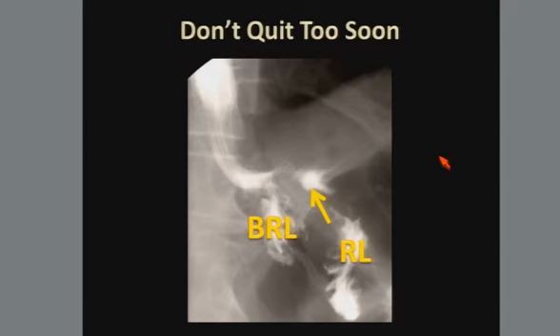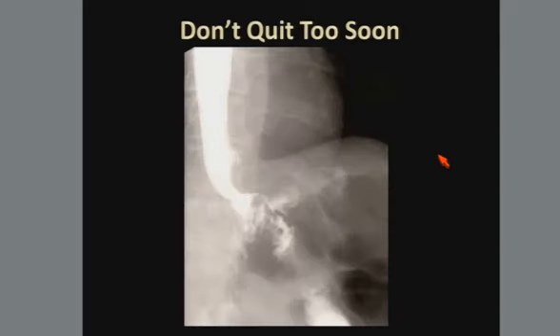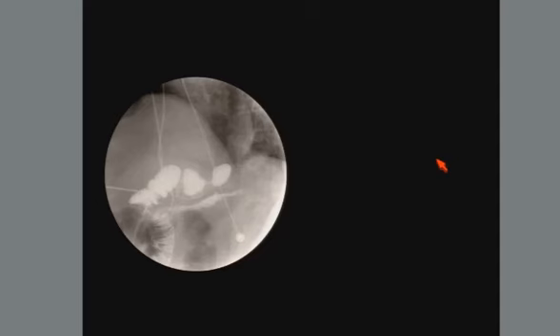This is key. If it's a free leak, they require immediate surgical intervention. If it's a gastrogastric fistula, the surgeons often sit on this and won't operate unless the patient has inadequate weight loss, and then they'll intervene. When we continued to reposition this patient, it was clear that this was spreading out under the hemidiaphragm as a free intraperitoneal leak. Now, here's an example of the gastrogastric fistula.